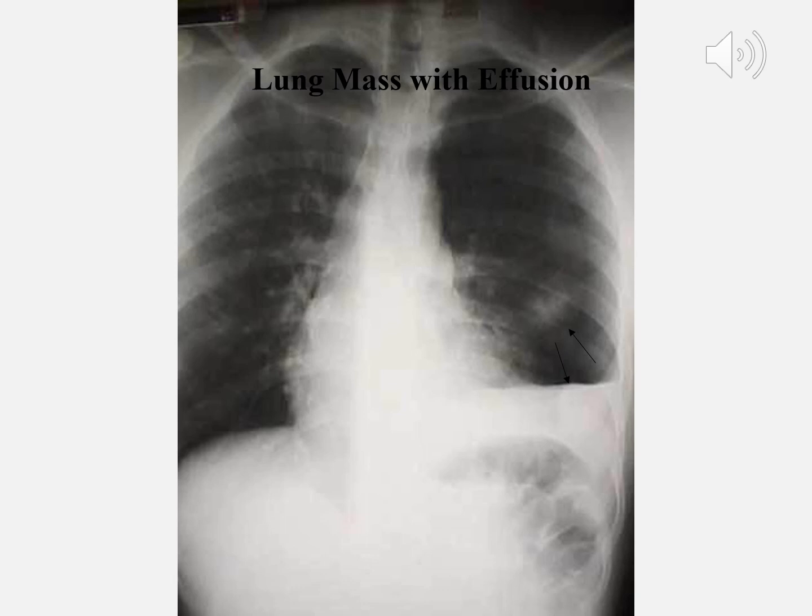But anyway, you can see the pulmonary effusion. You can see the mass. You can see in that left lung they have blunting of the costophrenic angle. That sulcus is filled in, and you can't see it there. A lot of times, lung effusions are from lung masses and from cancer and metastases, so you'll see them go together. Sometimes you just see the effusion and not the mass. Sometimes the mass and not the effusion, but a lot of times they go together. And I also want to say that effusions aren't always a result of a mass.